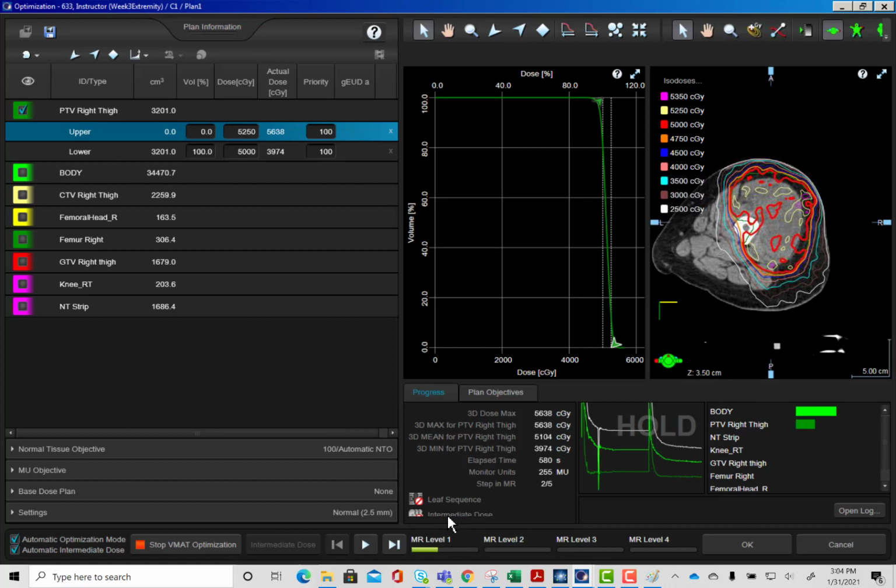Back to these levels. So in step 1, it leveled out. When it levels out, that means it's not coming up with any better solutions to your plan, okay? So if it's level, it's not really making any progress. You need to change something in here, or you need to let this optimizer continue, okay?